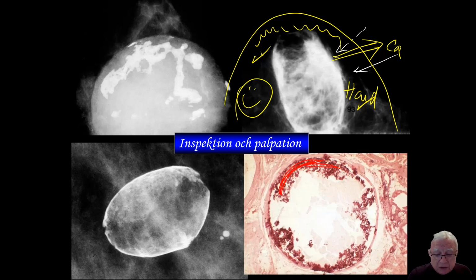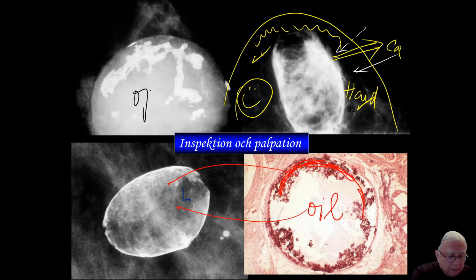This was the calcification, and inside here is the oil. This one and this one. It's easy when we see that radiolucency here. But what if it's radio-opaque? Then you ask the question, examine the patient, and you're going to find out that this patient had a silicone implant, and that unfortunately produced a capsule. You can imagine this is at least 25 years old, and it's harder than hard. Certainly not within the TDLUs, certainly not within ducts.